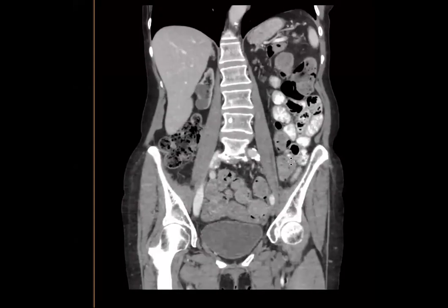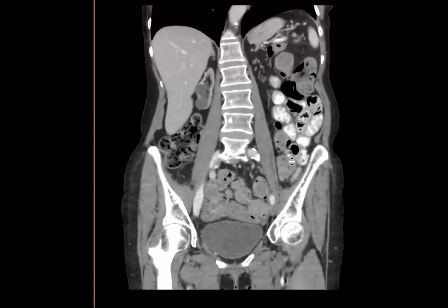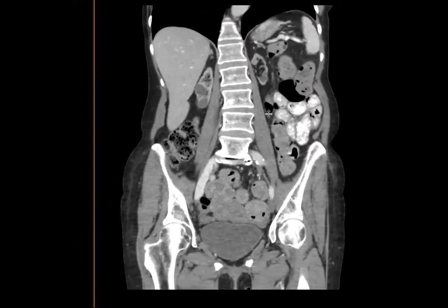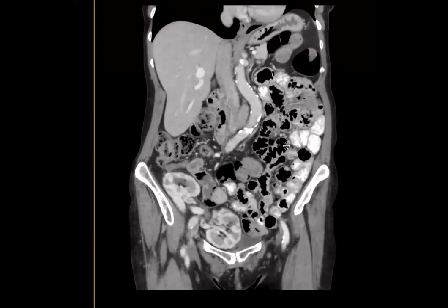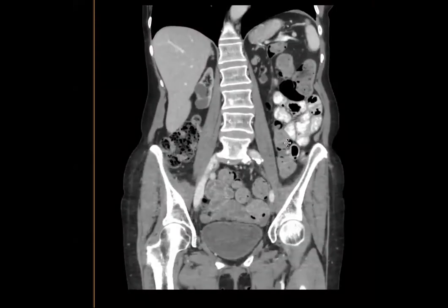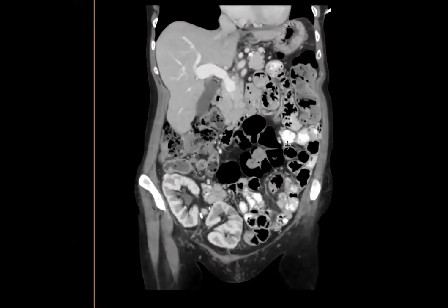Exactly. So this is an older patient and they have renal compromise because of long-term use of lithium. So the native kidneys are still there. They are severely atrophic. You're absolutely right. Wait, I have a question for the residents. So if there's 2 kidneys in the renal fossa that are atrophic, and then there's 2 kidneys in the pelvis, is it possible to have 4 kidneys?